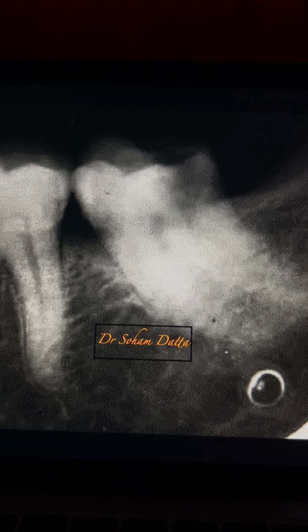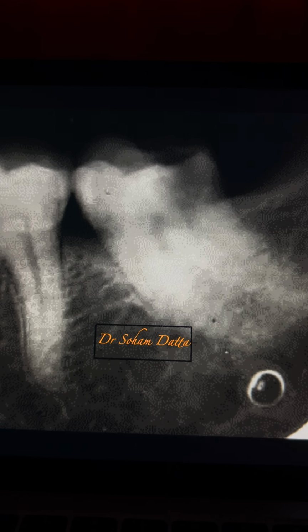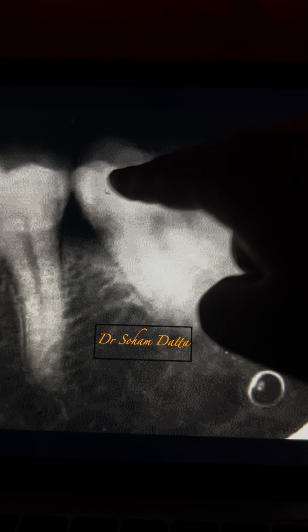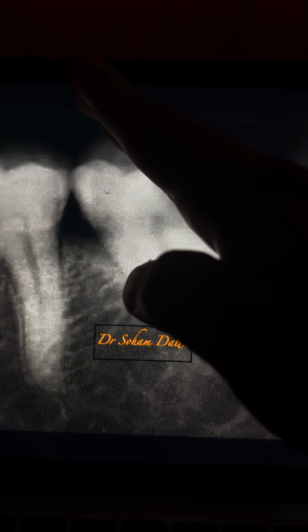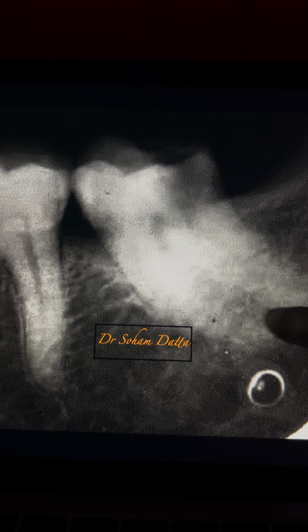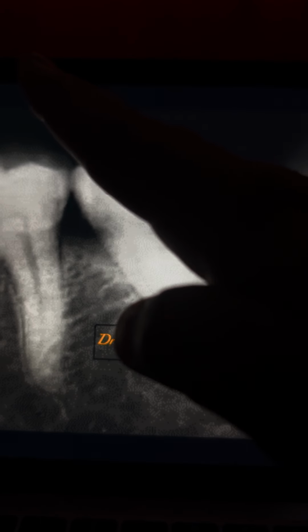And this 8 has had enough time to shift mesially, or rather tilt mesially, to come in contact with the 6. So the crown part is in the position of the 7, yes, and the root part is in the position of the 8. So it is like this.